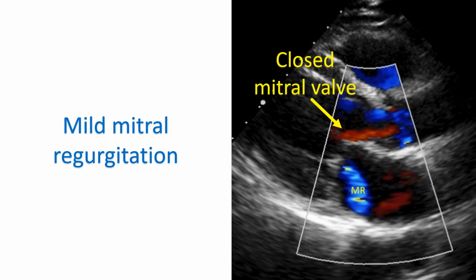But in case of a regurgitant valve, it is often difficult to make out a small regurgitant orifice between the valve leaflets when it is supposed to be fully closed. In that situation, Doppler echocardiography will show a high velocity mosaic jet across it, which is easily seen.